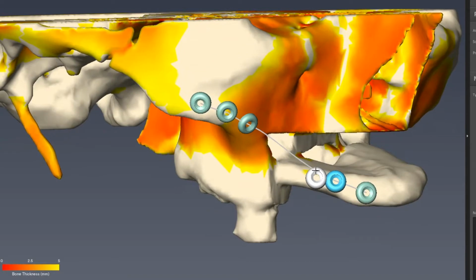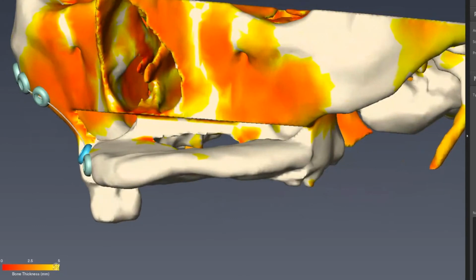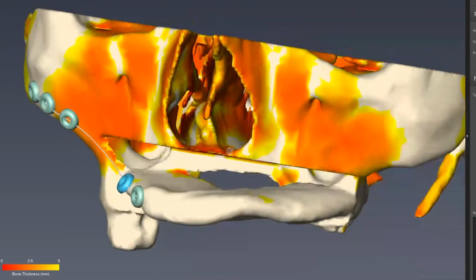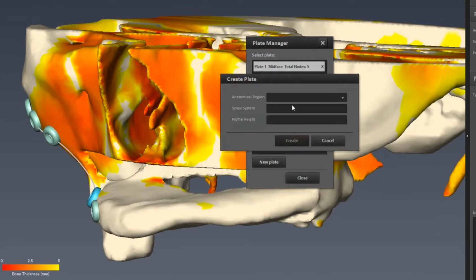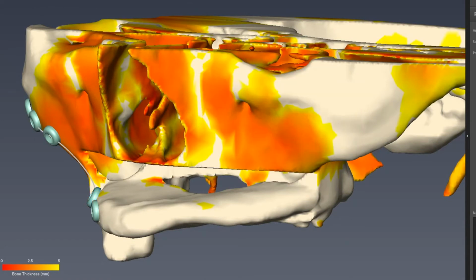And then can I move the holes on the scapula back? Of course you can, to wherever is thick. Okay. Yeah, it looks like the entire scapula, at least what we have simulated, is larger than 5 millimeters. There's just a couple spots that are highlighting. That's good. All right. And then I will get the next plate. And then we'll have 2 more plates, but I'll tell you where they go in a second once you've done that bit. Sure.